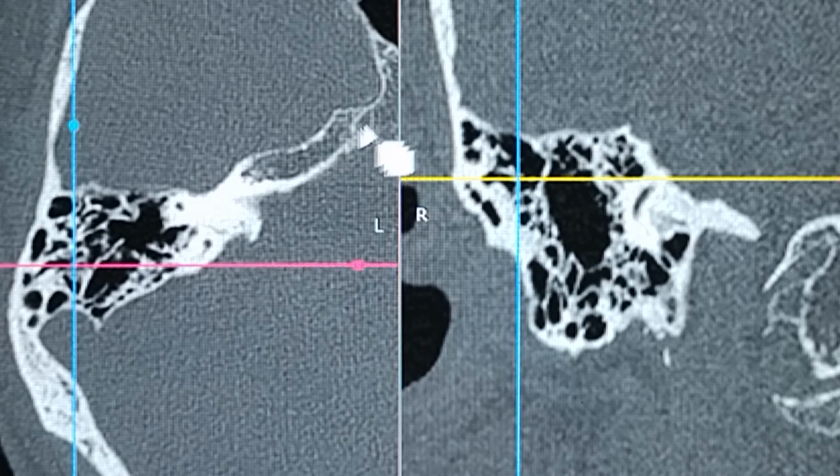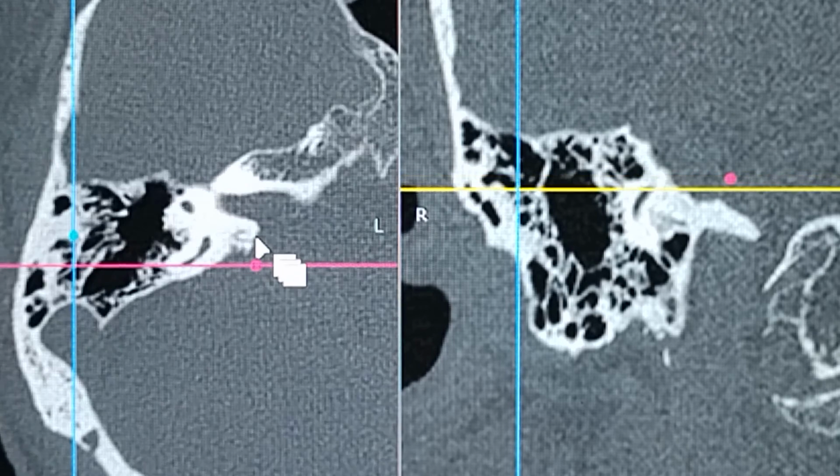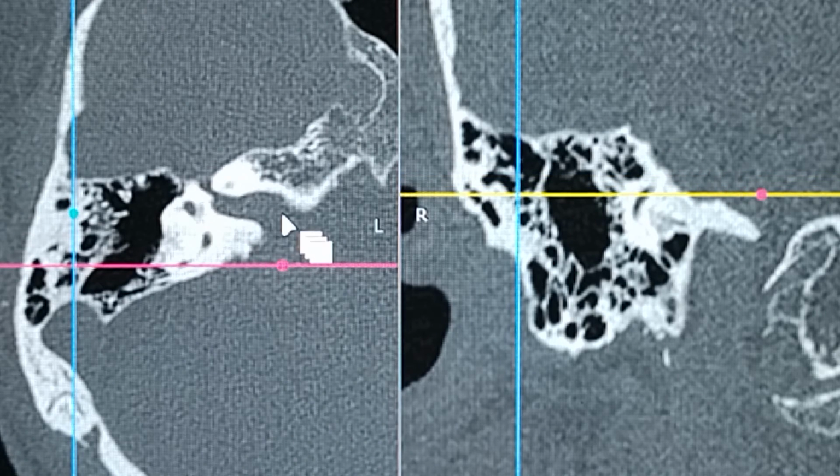So this is the petrous part, that's the clival part, you can see right there. Let me show you the IAC. Keeping on, see, this is the proper IAC. That's the brainstem area somewhere. The facial nerve arises from the brainstem region. It passes through the cisternal part. Okay, that's the cisternal part. Then it enters the IAC. You can see that's the facial nerve right there, and not the cochlea. So the cisternal part is the first part.